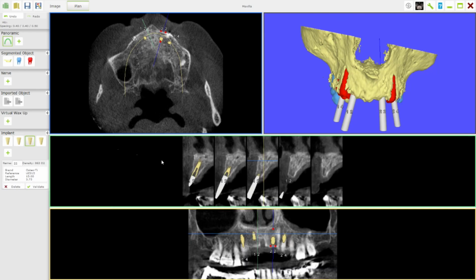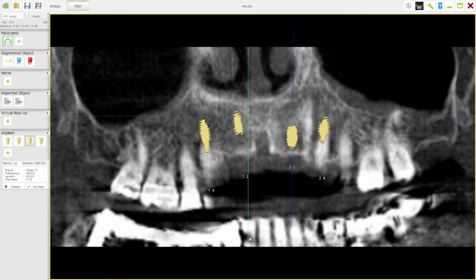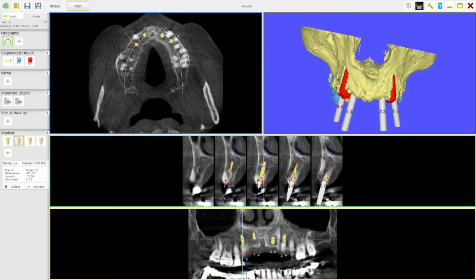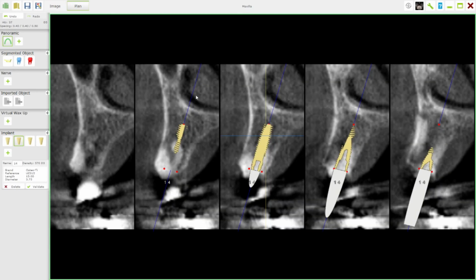If I want to come out of here and go into this section here, for example, or even better, I'll position my cursor to there and I'll go to the transverse section. As I said, you could even move the mouse around your implant, and by looking in this area here you can even get an idea of how good the bone is. Now you may wonder again what benefit that is. Surely if it's D4 or D5 bone, that is what you have. Where this is very useful is it gives you an indication of how much drilling you need to do.